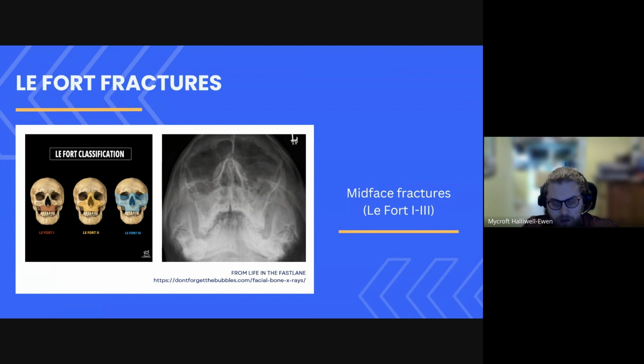Yeah, answer's good. I think this is quite likely to be a Le Fort 2. All right, and here we've got that classic pyramidal shape. Yeah. Good. Really worth learning, right? Really worth learning because they come up again and again. I've had to just relearn them all.